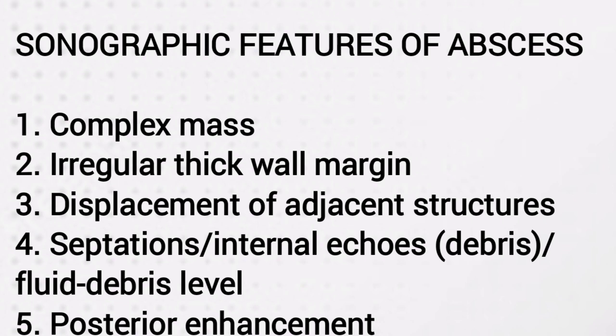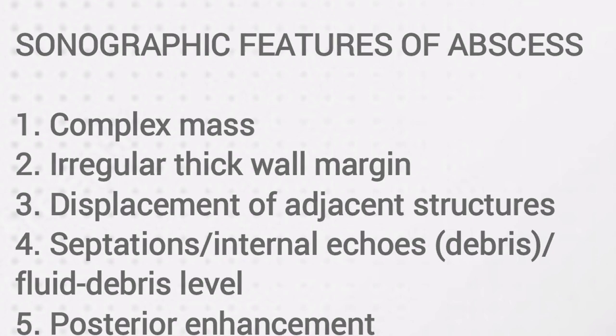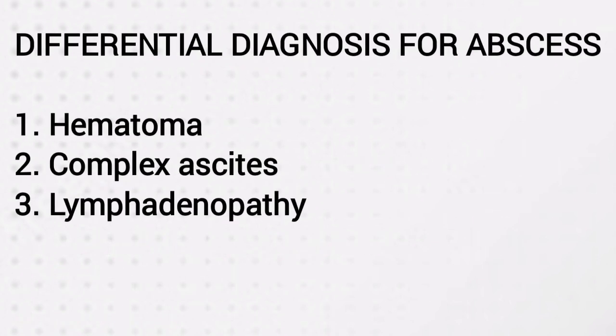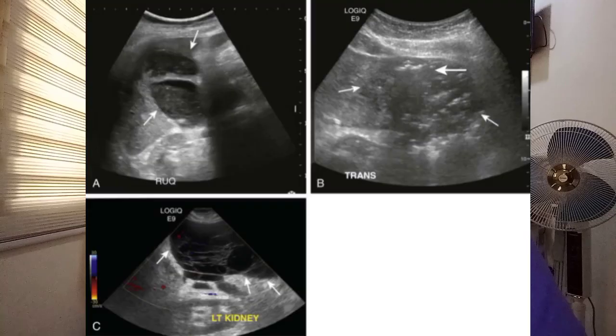And usually this mass is a non-vascular mass. However, the differential diagnosis for these will include hematoma, complex ascites, lymphadenopathy.